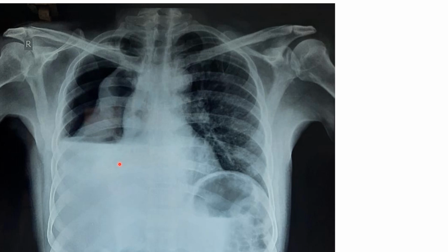So another X-ray. So on the right side you have hydropneumothorax. So above you have the dark through and through from the medial to lateral aspect sort of line, and below we have this white shadow, and this is the pleural space. This is the collapsed lung.